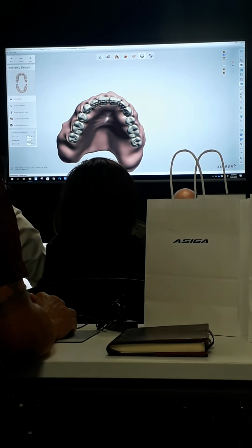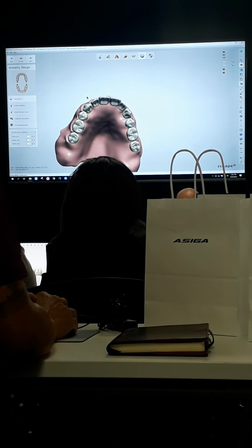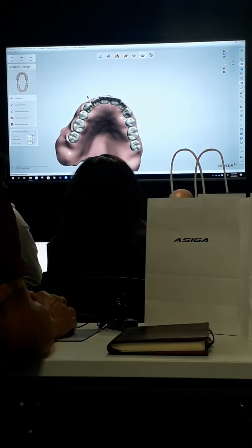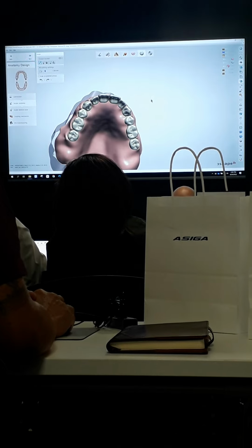The other thing you're going to want to watch for here is if you set up multiple bridges, you're going to have to do this step for every single bridge that you've done. So if you do 3 bridges, you'll have to do this step 3 times. If you do 7 bridges, you'll have to do it 7 times, and so on. So I'm going to hit next here, and it'll take me into my sculpt anatomy.